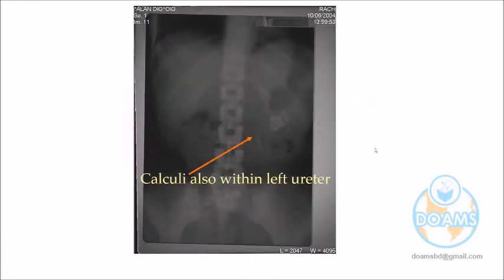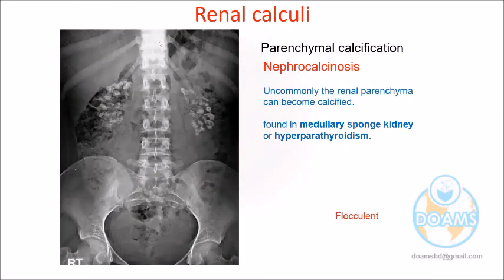What is this? Ureter. Ureter. Yes, now. So sometimes the calculi may be visible in both kidneys. Nephrocalcinosis. If there is bilateral calcification, it means some metabolic disease, especially hypercalcemia. Okay? Hypercalcemia, and hyperparathyroidism is the most likely underlying diagnosis.